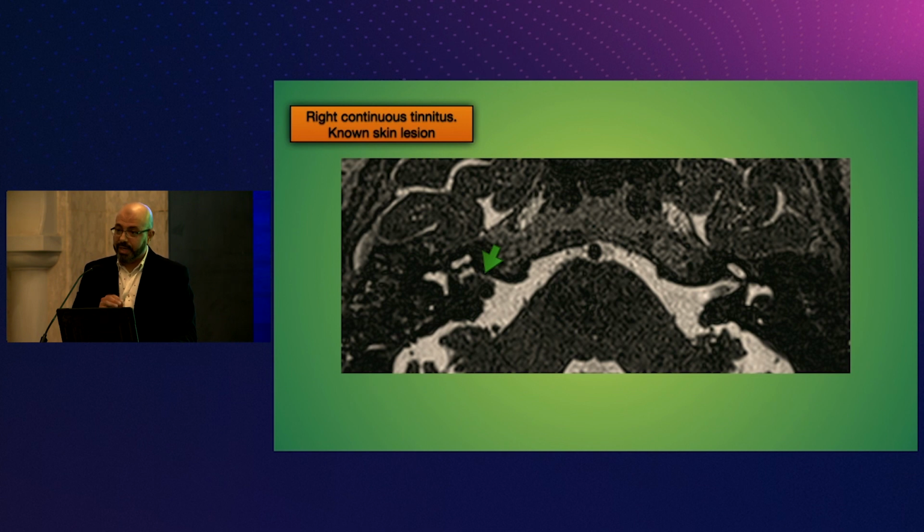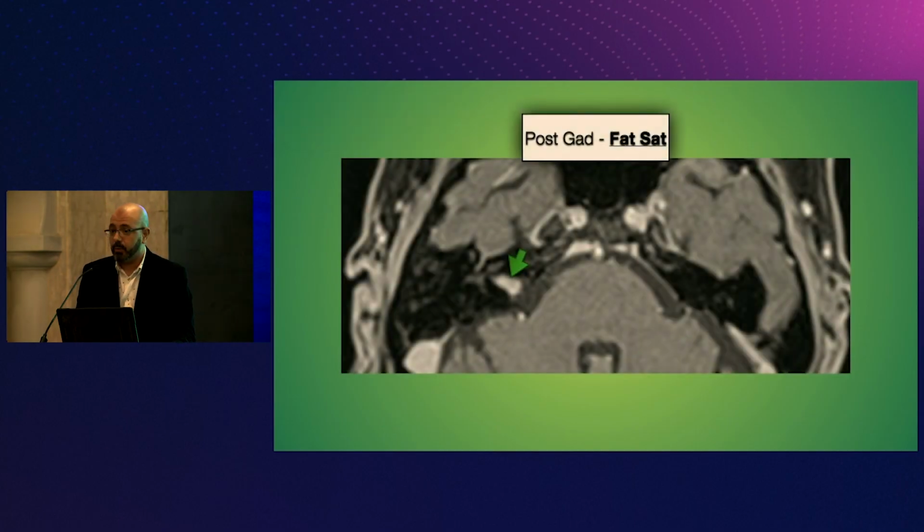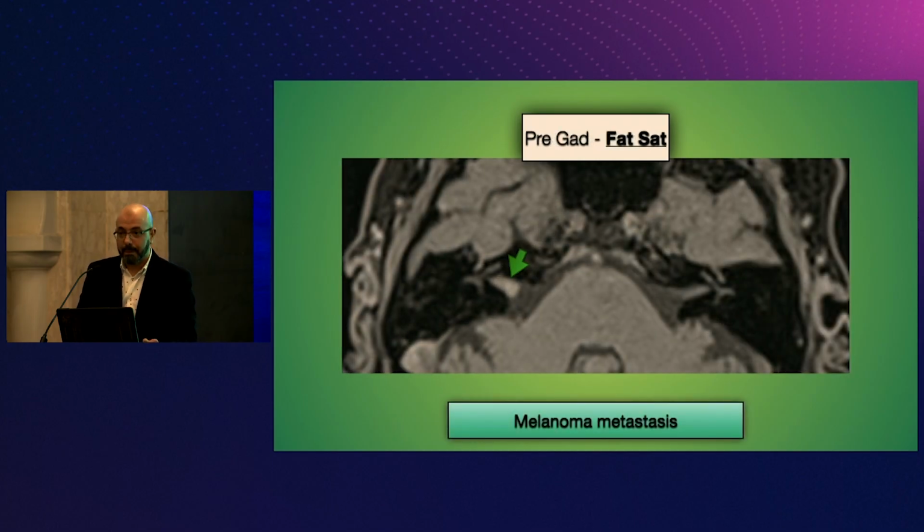And here, this lesion is, classically, you can easily say that this is a vestibular schwannoma, right? But look at the post-GAD first. Again, you can say that this is a post-contrast sequence of an enhancing schwannoma, right? This is the post-contrast fat-SAT. That's the pre-contrast fat-SAT here. So what is it? Still can be hemorrhagic schwannoma, but these are exceedingly rare.